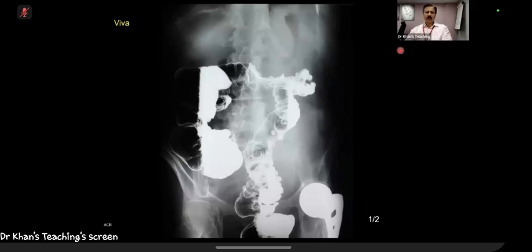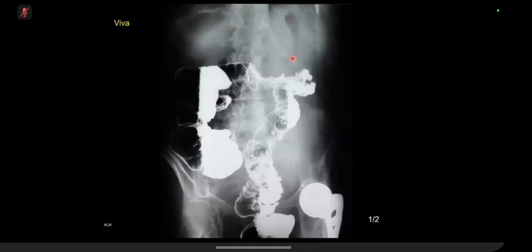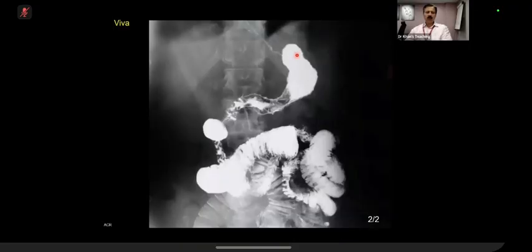And I am again with candidate 3. What do you think this is? This is linitis plastica, the stomach shadow. Okay. So now, if you see here, this is a barium meal or follow-through examination of the same case, where now you understand what is happening.